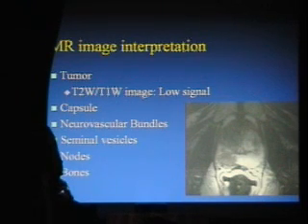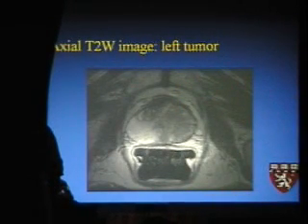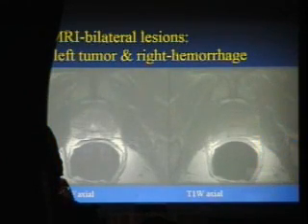Management of those patients can be quite different. The BPH can make the gland extremely difficult to treat, and if it's big, it's complicated, so you need to measure them. Tumors can be diffuse as well. They can be like this one here on the left, where it's all the way through the left gland, and it's normal over here. Hemorrhage will occur after biopsy.